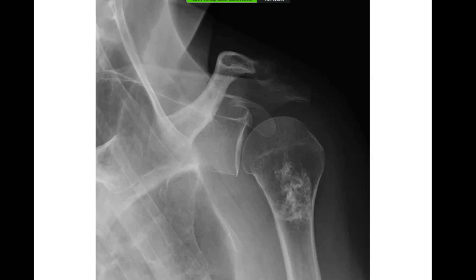It can be secondary if a patient has taken any chemotherapy, so it can happen due to the side effect of the chemotherapy, or it can be an enchondroma as well. For the differentiation between bone infarct and enchondroma, the definitive diagnosis can only be made on an MRI. If it shows fat, it can likely be a bone infarct, or otherwise the enchondroma will have the cartilaginous matrix and the cartilaginous pattern of the lesion. Yeah, very good.